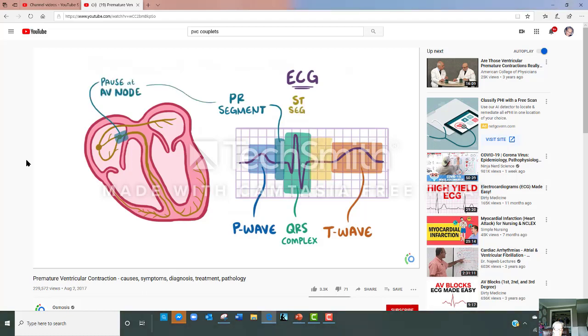And this one is called the ST segment, and it corresponds to the interval between ventricular depolarization and repolarization. And this one's called a TP segment, which represents the heart's quiet time when the cells are finished repolarizing and are ready for another signal.